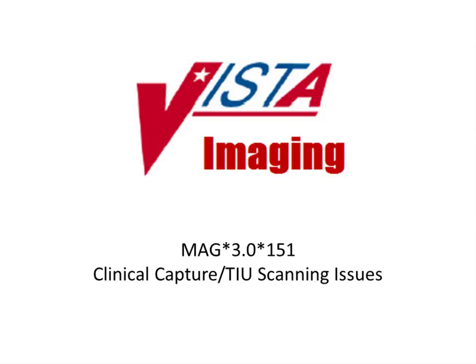This module will cover the changes made to the Vista Imaging Clinical Capture software in patch 151. It is suggested that the previous modules in the Vista Imaging Clinical Capture 101 series be viewed prior to this module in order to become familiar with the basics of document scanning and image captures.